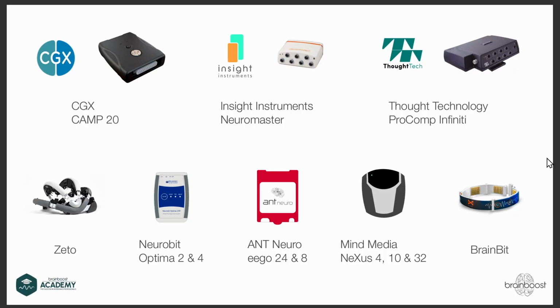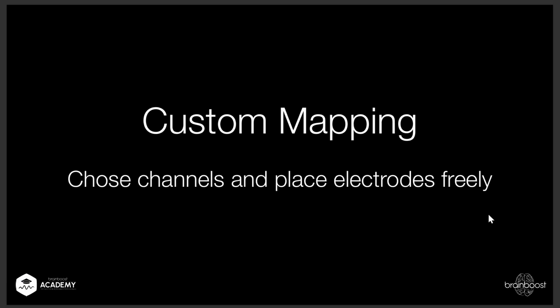You're welcome. So with this one here, you see this covers the occipital and the temporal lobe. This will not work. But if you have the BrainBit where you can place the electrodes on other positions, then it will work. And this might be something coming up in the next webinar, volume 2, with different templates for other positions as well. But it needs to make sense that some positions pop out a certain category.